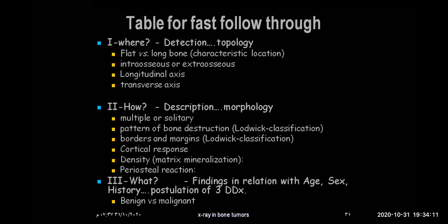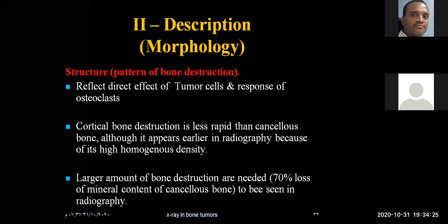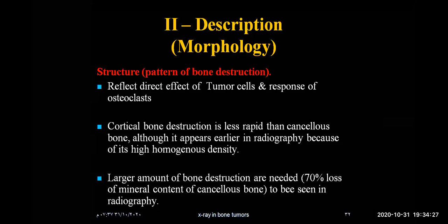Now, the most important thing is the pattern of bone destruction. This actually reflects the direct effect of tumor cells and the response of the tumor by osteoclasts, the activation of osteoclasts.